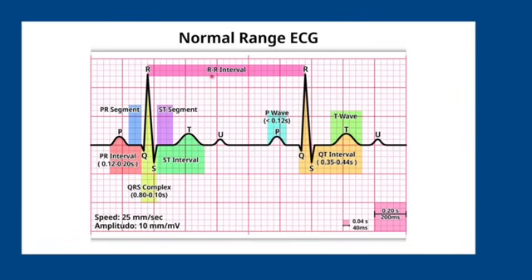Occasionally, you may see the U wave, which represents the final part of the ventricular repolarization. The RR interval represents the distance between following cycles, and it is important to determine the regularity of the heart rate, because if the RR interval is equidistant between each cycle, this means that the heart is regular. At the same time, we use it in calculation of heart rate.